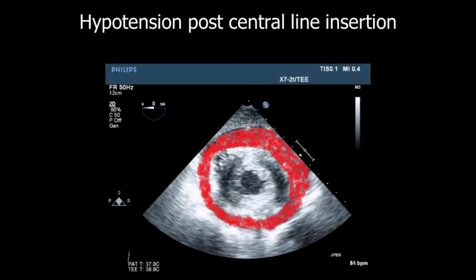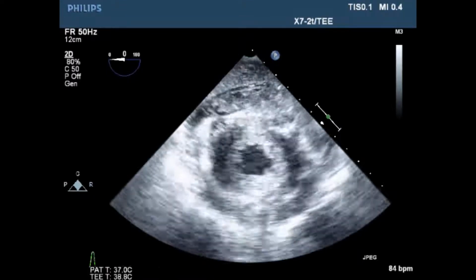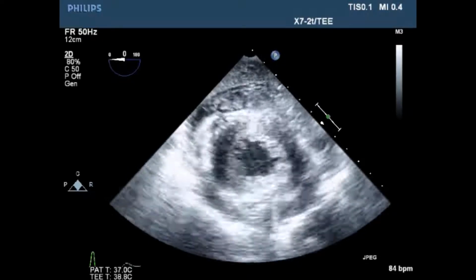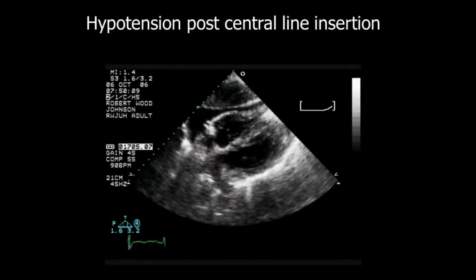This patient underwent a sternotomy as they had arrested, and then a lot of clots were taken out, and the patient ultimately did well. A small puntiform injury in the pulmonary artery was noted and repaired by the cardiac surgical team. Another case of a patient in which a surface echo, a subxiphoid window echo, noted effusion post-central line placement.